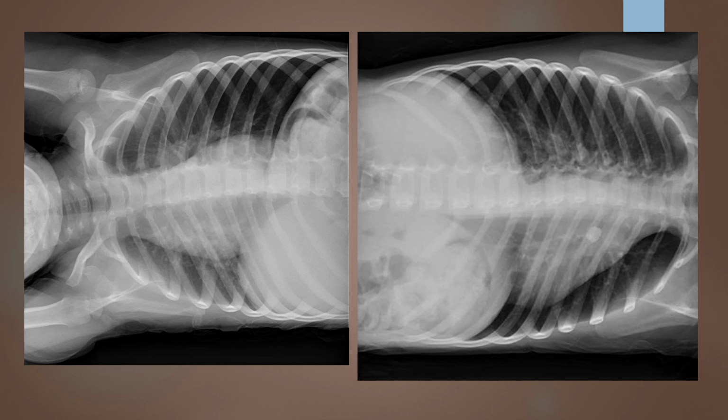So here's a couple examples. So number 1, we're going to see if all the anatomy is there. So a global view, I'm seeing apex to costophrenic to costophrenic to apex. It looks like both of these apices are slightly clipped in this case. Over here, I'm going to see apex to costophrenic to apex. All of my anatomy is on this one. So I know that we're going to have to repeat this one over here. We're good to go on this one at this point.